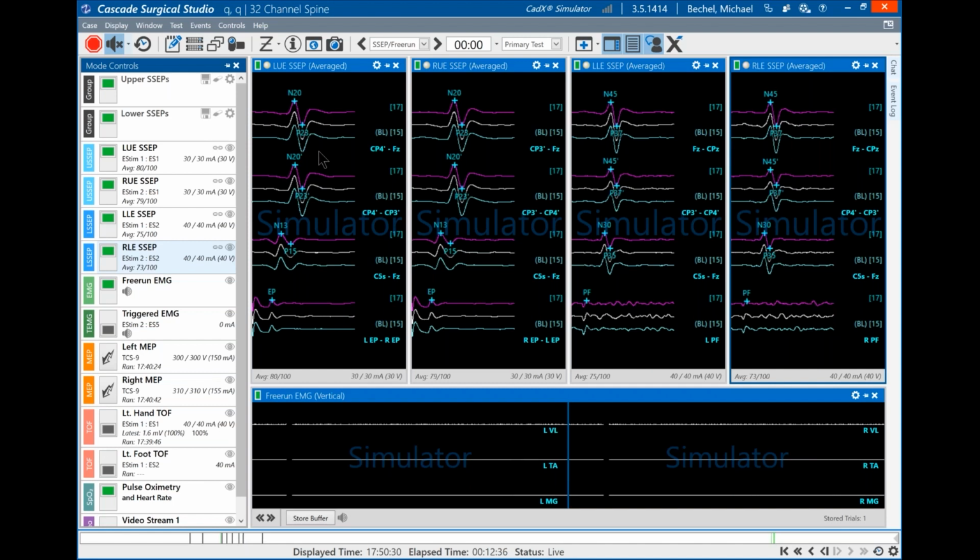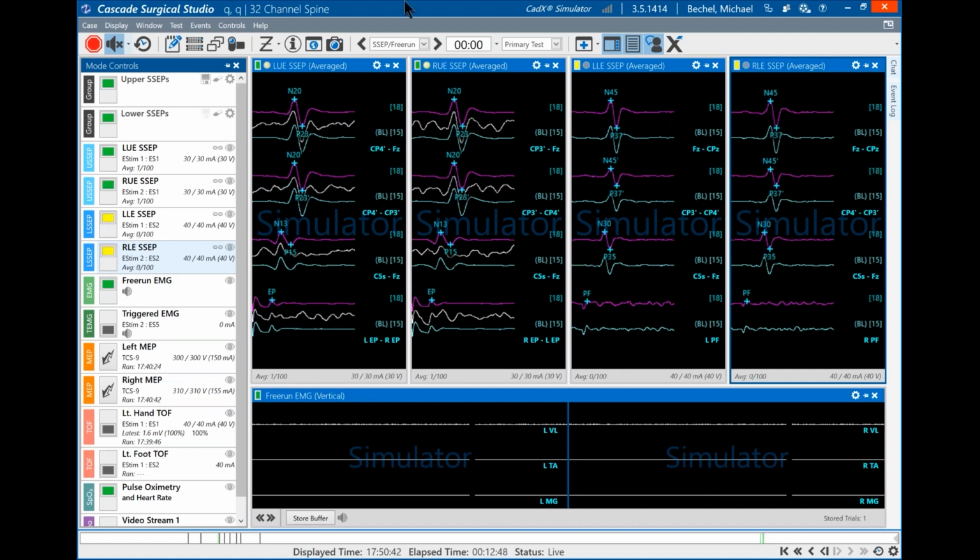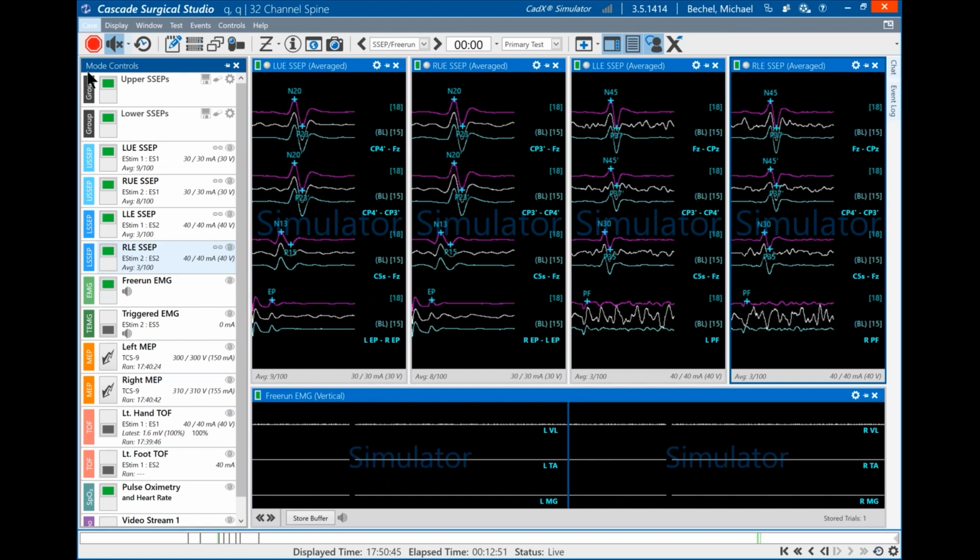Okay, next on our outline, CADlink. I'm going to close this case here and do a little discussion of CADlink.